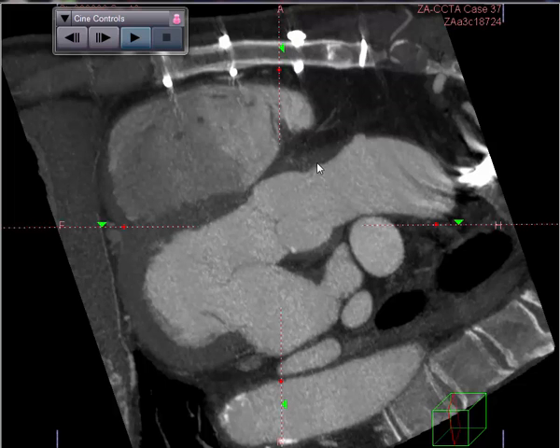So in terms of disposition, frankly, nothing else needs to be done. We've identified the grafts and indicated that this patient should not be having any ischemia as a result of his surgery.